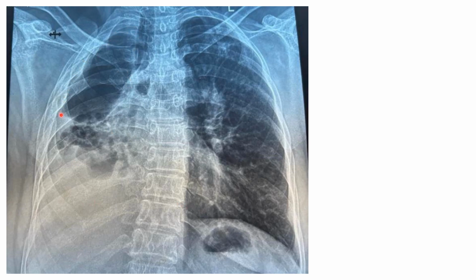This is a cavity, right? So there's no bronchovascular markings, and it looks large up here without any avascular structure. So this is an air-filled space surrounding this thing. It's a large cavity. And here you have some cystic spaces and fibrosis down here.